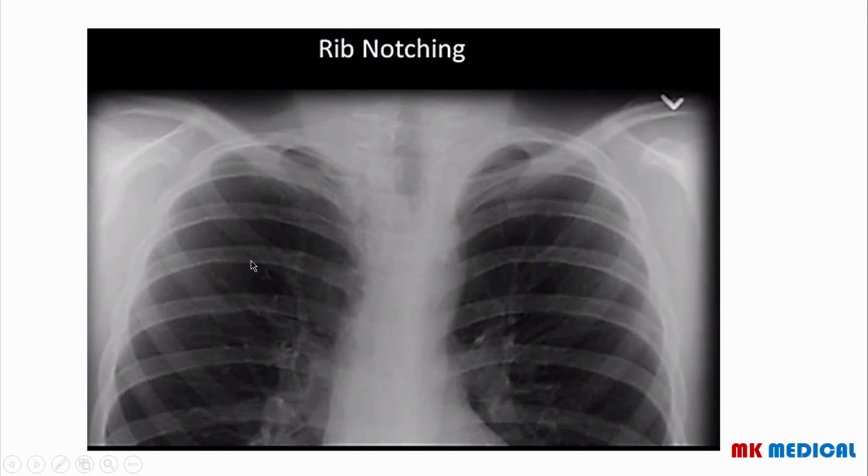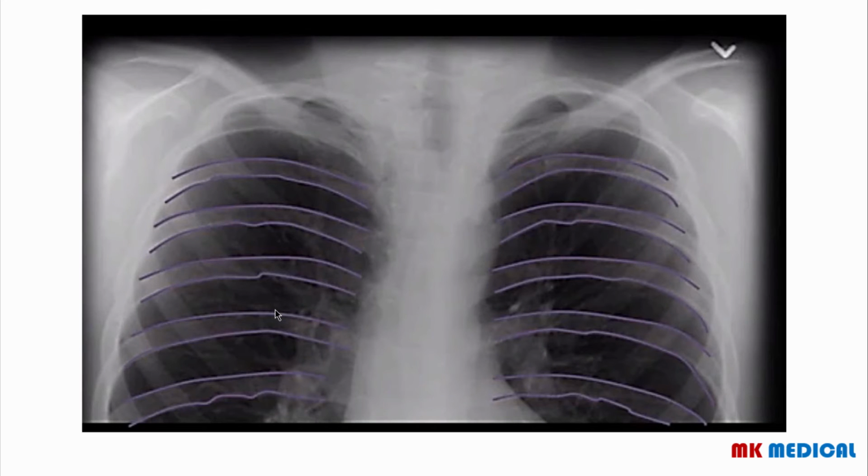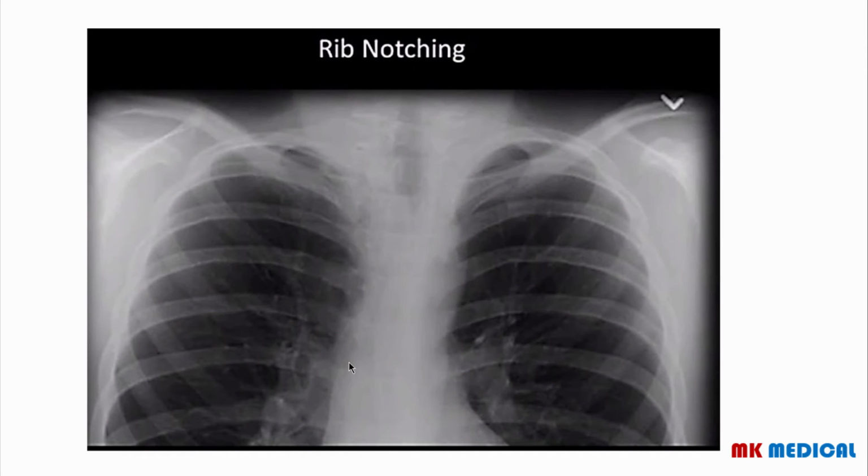If you still can't see them, then I decided to superimpose another image. So I will superimpose an image and then you should be able to see them very clearly. So these are where the rib notches are. As you can see, there's notching here, here, here, and there. So if I go back to that other image, you should now be able to see the rib notching that I superimposed in the next image.